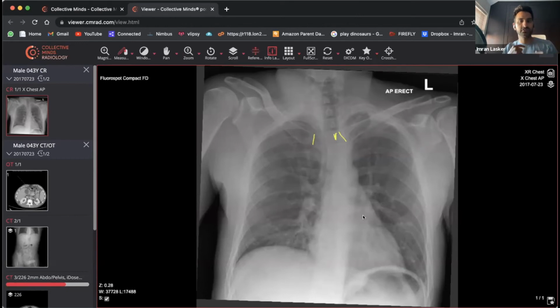And that's why you don't use the clavicle with the sternum, because if you have something so close to each other, for them to go out of line with one another takes quite a while, right? Whereas you've got something quite far from each other, they get out of line quite quickly. So it's a really good way to figure out whether someone has a rotated film. But on this one, we don't really see anything grossly abnormal. Everything looks okay. I'm not particularly worried about this.